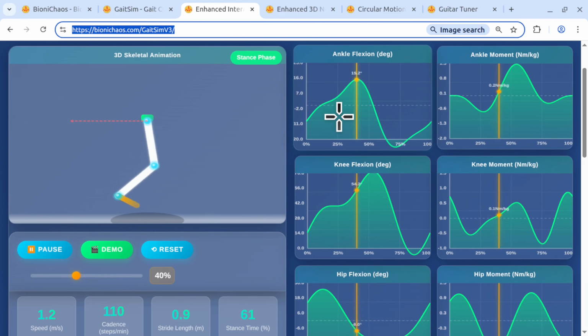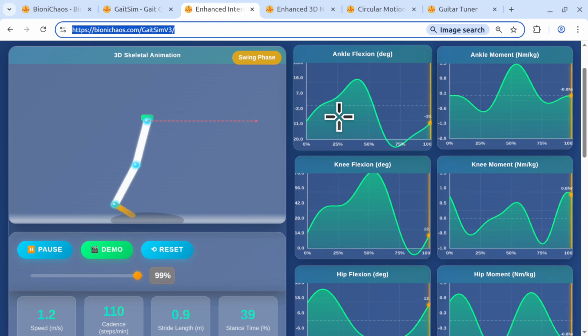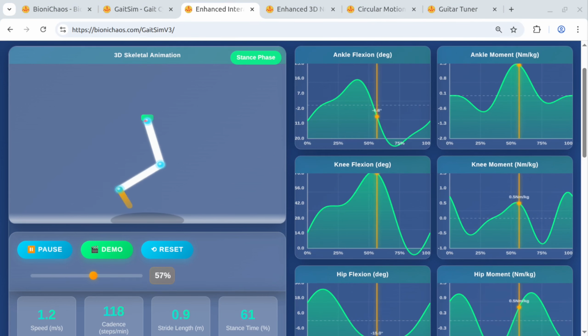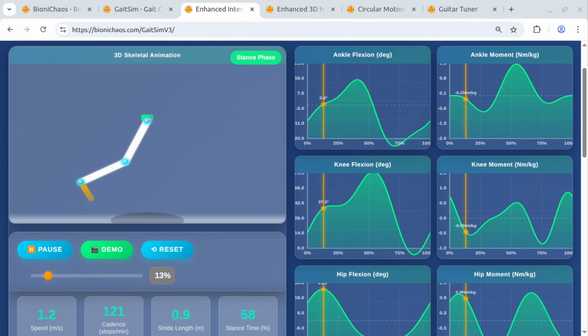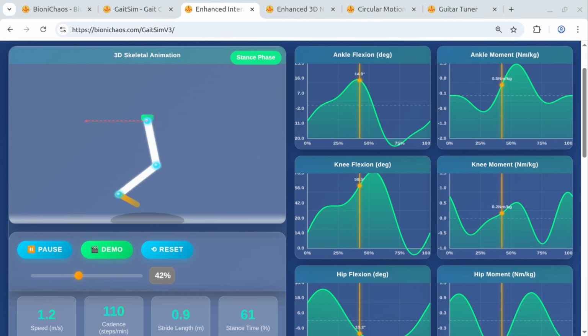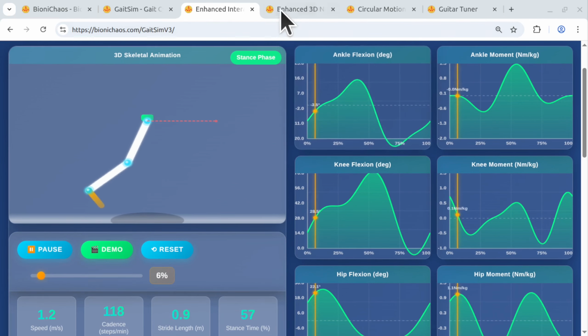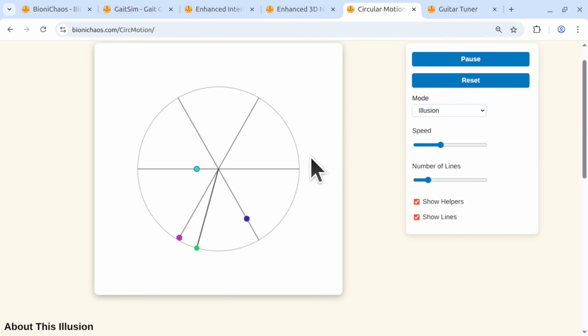The idea for it is that later we can add the different conditions. So you can have gait freezing like you have in Parkinson's and things like that. Yeah, also been doing other simulations as well.